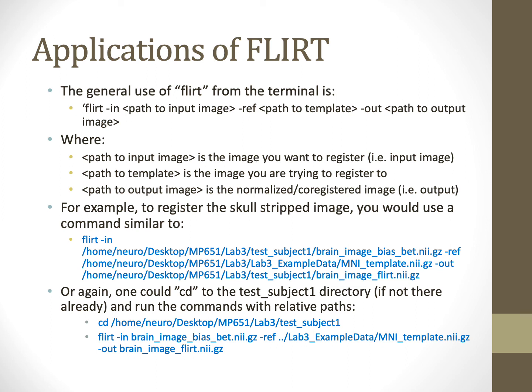However, we will use FLIRT from the terminal, and the general command for using FLIRT from the terminal is here. First, you provide an input image, which is a path to that input image. You provide a path to the template based on the -ref option, and then also a path to your output image based on using the -out flag.